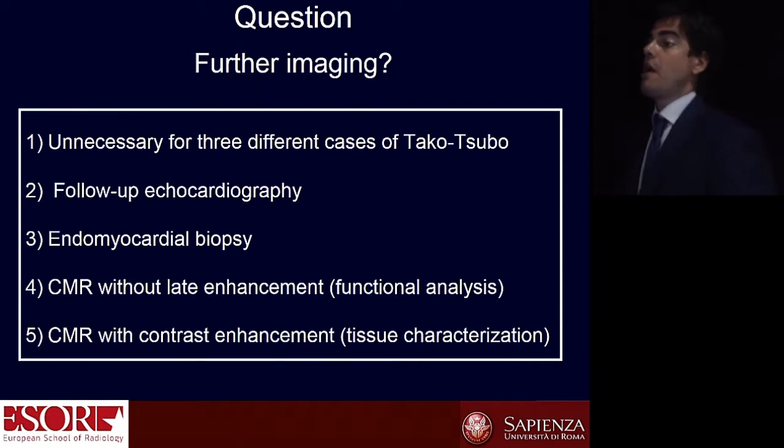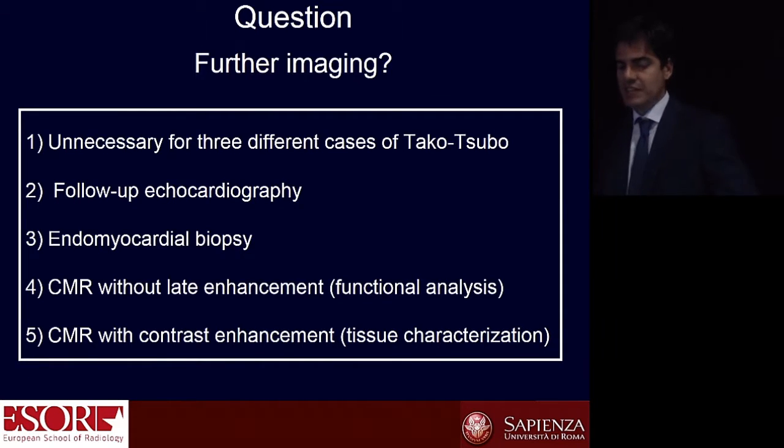So the question is, why did we do MR in these cases? Or how would you approach? I won't ask you to raise your hands, this is more a discussion. Imaging is definitely necessary. We need contrast enhancement, and I will show you why. Let's start with the cine.